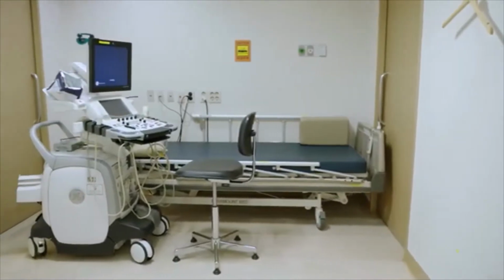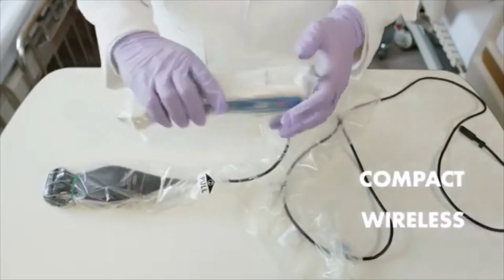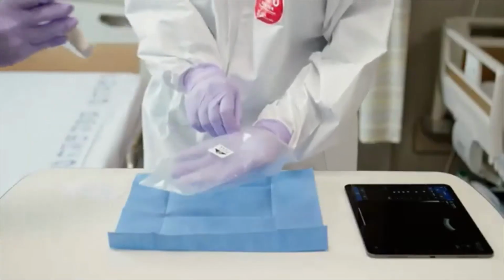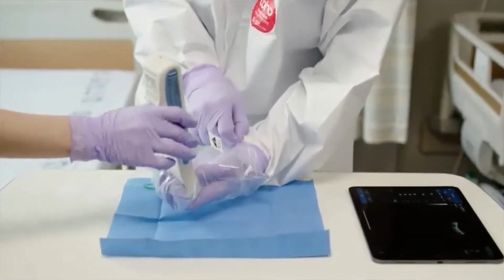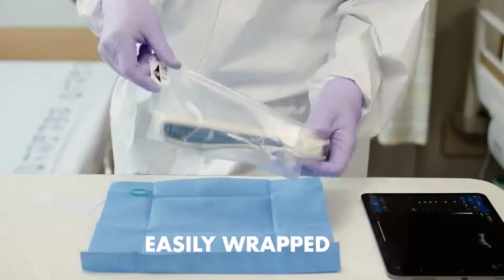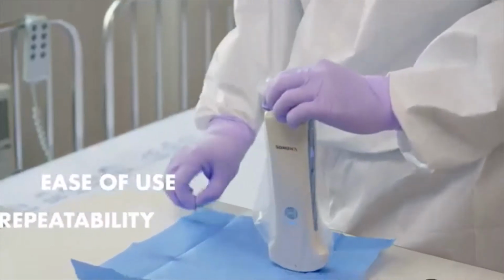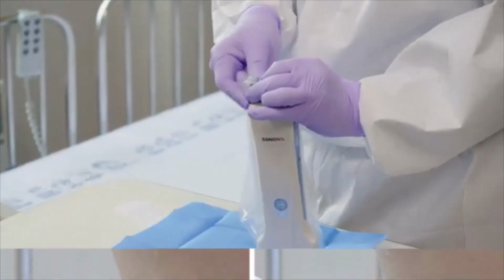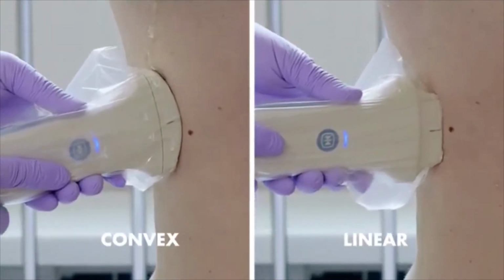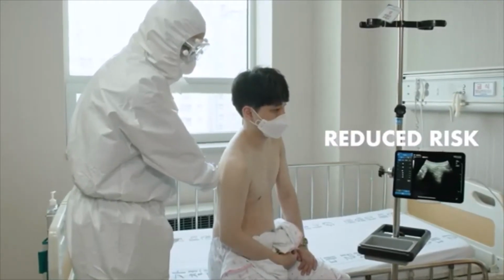Unlike bulky and wired ultrasound devices, Sonon is compact and wireless. This gives it a clear advantage in COVID-19 screening centers, where it can be easily wrapped in a clear disposable plastic cover. Once a test is complete, the plastic cover can be disposed of and a new cover put on to get the device ready for the next patient. This process significantly reduces the risk of secondary infections.